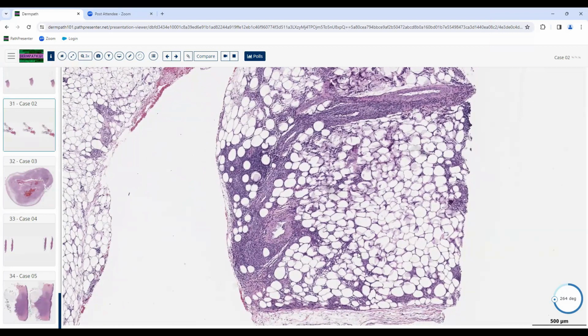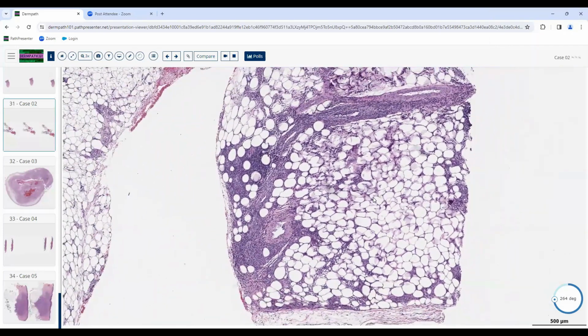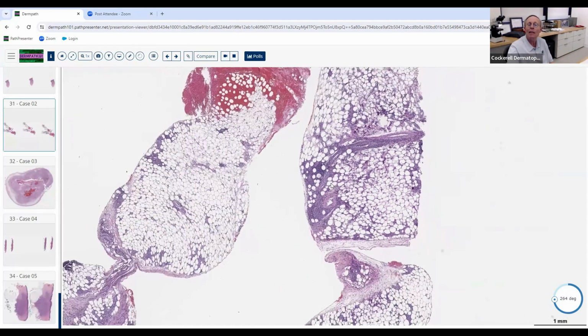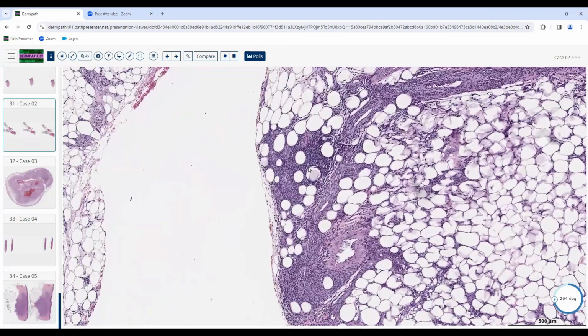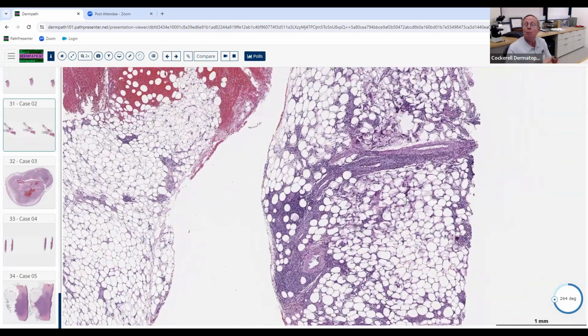Okay, anybody know? Lupus panniculitis? No, that's nodular vasculitis. Erythema induratum, vasculitis, lobular panniculitis, degenerative fat, suppurative granulomatous inflammation, a lot of times suppuration. That's nodular vasculitis. We don't have that here. We've got eosinophils and lymphs. So erythema induratum? That would be vasculitis plus lobular panniculitis.